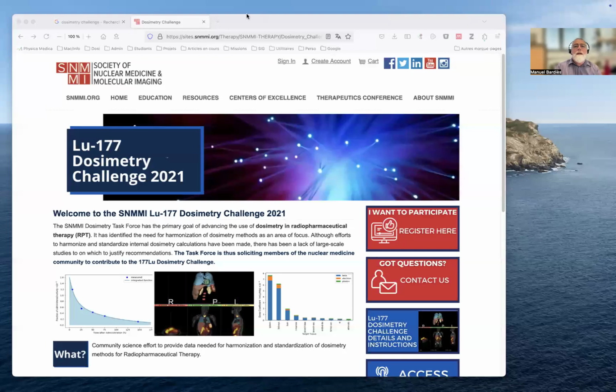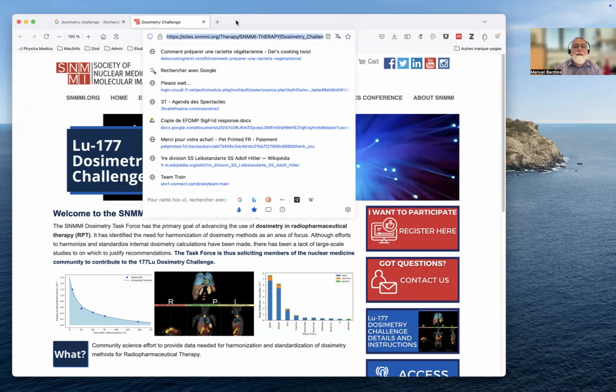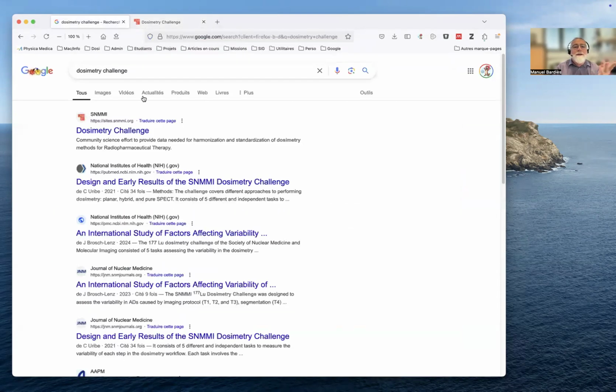So I'm going to share my screen. Here we go. So I have opened the page of the SNMMI dosimetry challenge. To get that link is very easy. We will try to put it in the video, but it's just a search on dosimetry challenge. And this is the first result that came back, SNMMI dosimetry challenge.